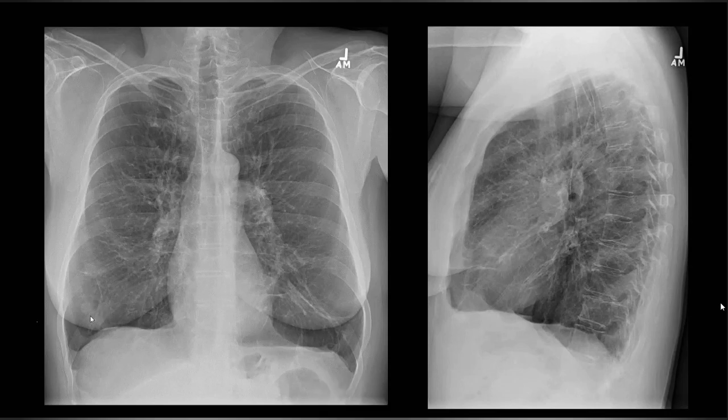No, these are not Kerley B lines. Kerley B lines are usually over here, which can suggest edema, but I don't think there are any Kerley B lines. These lines are over here. What are these called? These are reticular lines, right? Yes. So there is lower lobe predominant reticulation. See this line over here? Yes, sir, a meshwork of reticulation. And the other important thing you said is that the lung volumes are increased, correct?